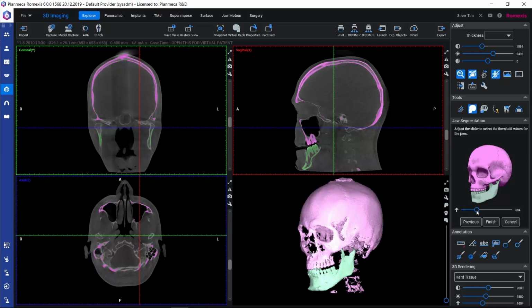But then on the other hand, if we drag this too low, let's see what happens. If we get the failed segmentation result, not yet. But if we would drag this very low, there might be the risk that the segmentation fails here on the border of mandible and maxilla, and we get also basically all of our data included in the mandible.